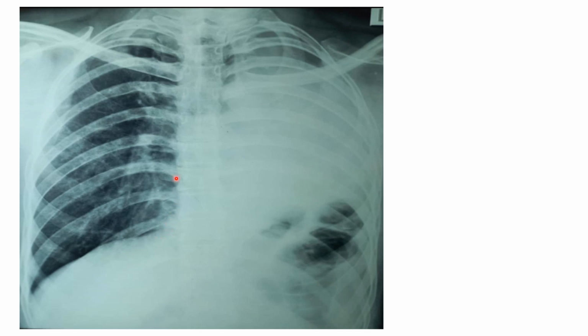You can see that this right lung is coming up till this space, right? Normally when there is a cardiac shadow, it slightly crosses the midline to the right, and the right heart border is present up here, but here this lung is fully occupying this space. It itself indicates that the lung is hyperinflated and moving towards the center, and the cardiac shadow has moved to this place.